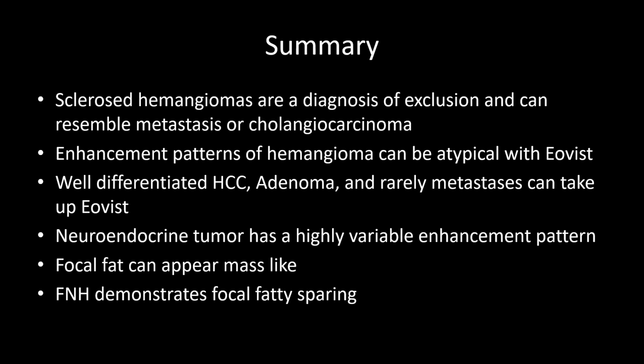Neuroendocrine tumor is highly variable. I cannot stress that enough. And having multiple phases on CT or having an MRI to assess for treatment response or to be sensitive for detecting metastatic disease during initial staging of neuroendocrine tumor, it's highly recommended.